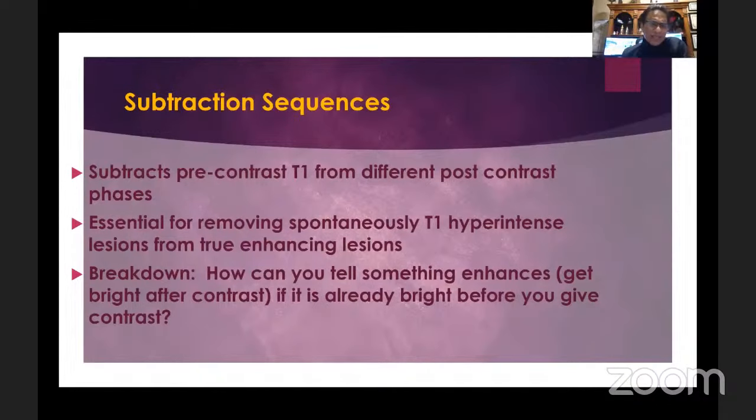So essentially in this, you are subtracting pre-contrast images from post-contrast images. So it will subtract out the hemorrhage, hyperintensity within the lesion, and it will just give you pure enhancement within the lesion, which helps you a lot.